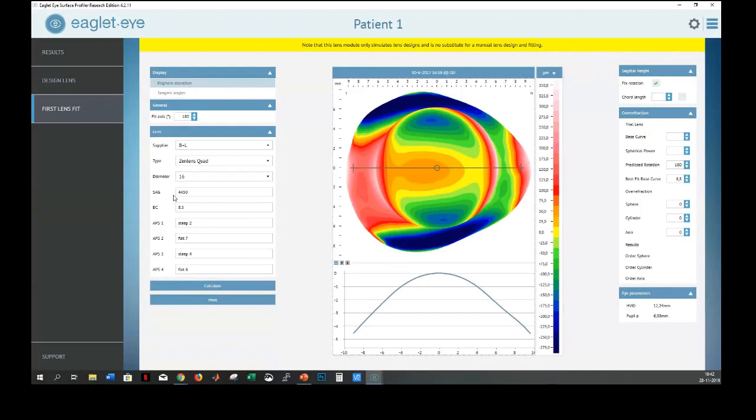Well, if you want to look in your diagnostic set, the first lens you find is a 4,500. So that will be the lens you use on the eye. The standard base curve of this diagnostic lens is 7.6. So I'm filling in here the base curve 7.6. The spherical power of your diagnostic is -2. The rotation was already predicted by the algorithm, so it is predicting 180. The best fit base curve is also already there because it's taken from the predictions.